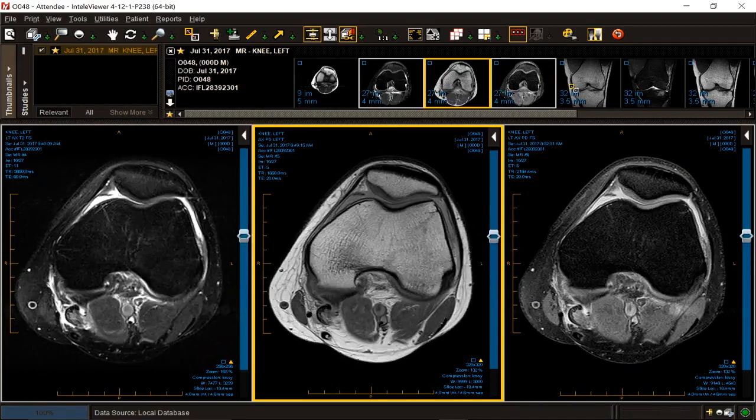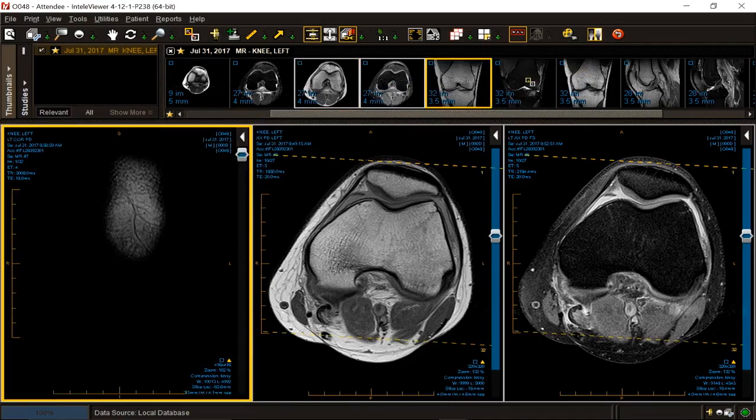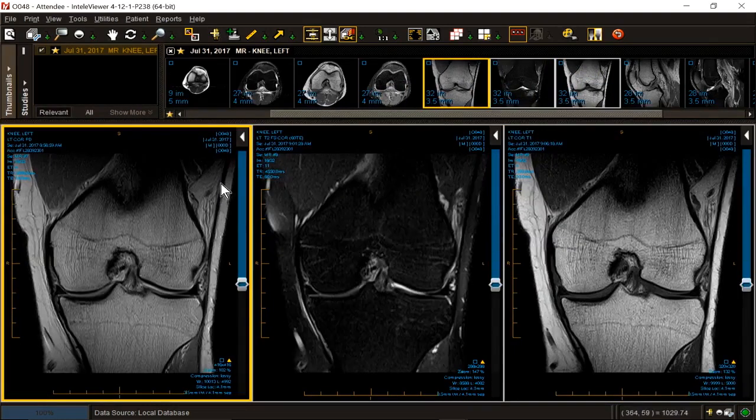All right, let's put something else up. We've got 3 coronals. We've got places to go like lunch. So that's the next thing that faces us. There's 3 of them. There's a lot of them. Let's scroll.